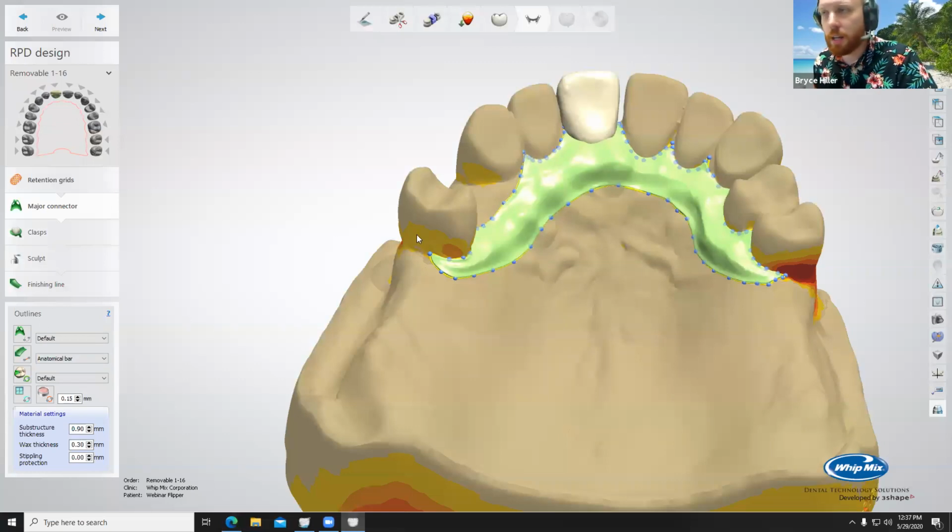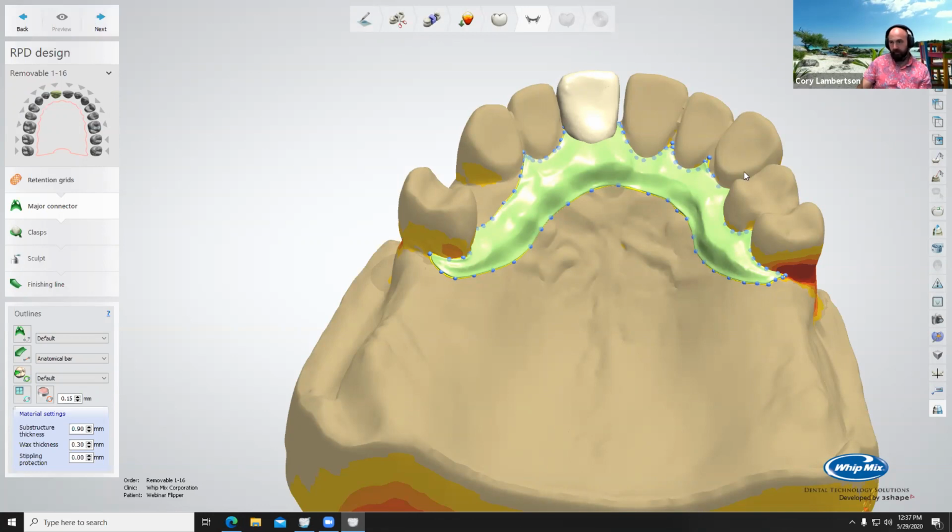All right, waiting on Alan. So I think he'd be referring to putting a bead line to help create a seal, not retention, but seal. The bead line technically should have been put in before you scan it in.